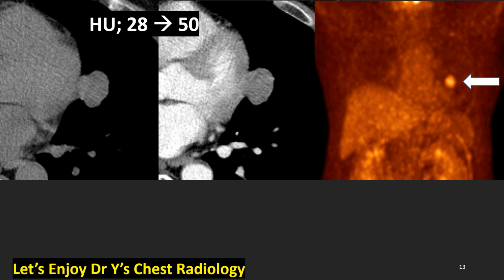These findings are a little different from typical carcinoid, because typical carcinoid usually shows strong enhancement on CT and poor uptake on PET-CT. But this atypical carcinoid is rather contrary to the typical carcinoid and somewhat similar to lung cancer.